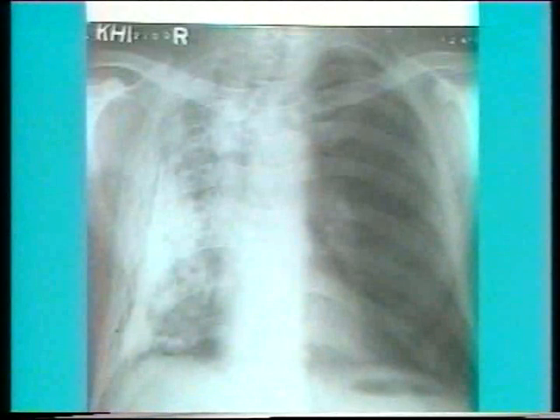This is another X-ray of pleural calcification with dense irregular sheet-like opacity. Note in the close-up view its density, pattern and the typical appearance.